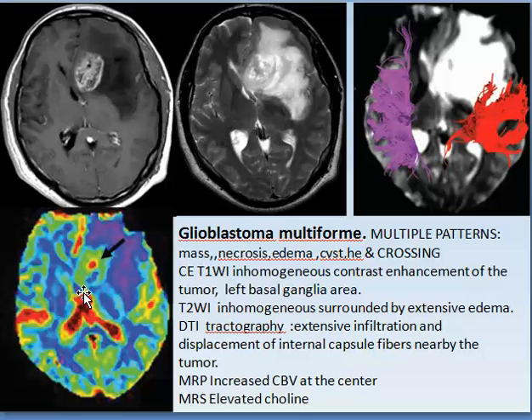And finally, MR showing increased cerebral blood flow, cerebral blood volume at the center of the tumor.